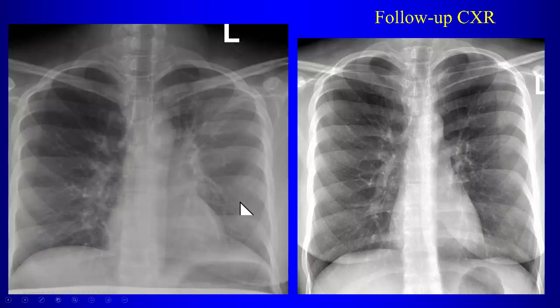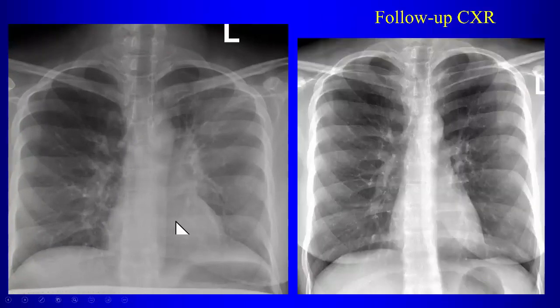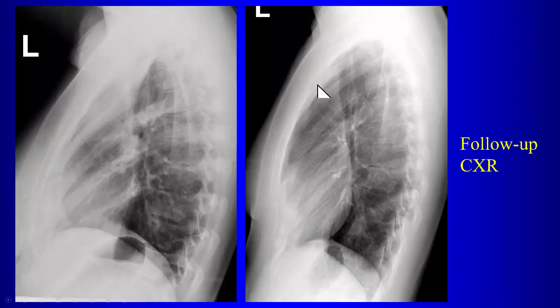Now, I agree from the frontal view, left upper lobe atelectasis is the sneakiest of the lobar collapses on the frontal view, right? It can always surprise you. You just have these kind of vague abnormalities. But if you notice that there's volume loss there in the left upper lobe, then you can think about it. And then you ask for a lateral view, because the lateral view is the easiest for you to see left upper lobe collapse. You can see the major fissure deviated anteriorly, and then all that opacity there represents the collapsed left upper lobe. Okay? So again, compare this lateral view to the normal lateral view in the same patient. That's what it should look like. This is the collapsed left upper lobe up here.